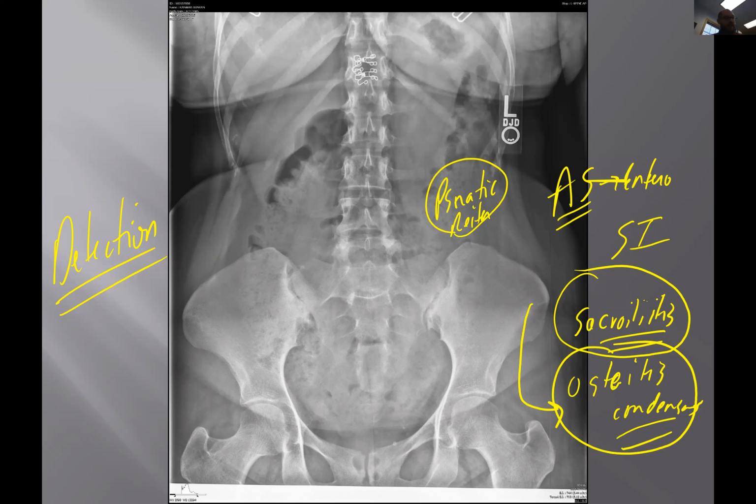So that's great. You nailed another diagnosis. Osteitis condensans ilii gives you that triangular region of sclerosis after childbirth. And I wanted to remind you that you can see this with leg length discrepancy. If you get about 1.5 centimeters of leg length discrepancy, I almost guarantee you that you're going to throw out abnormal stress-related X-ray changes in the SI joints. We need to start looking for this.